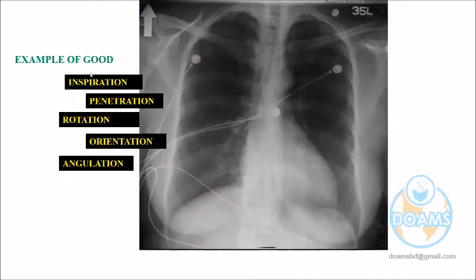Now, an example of a good X-ray. Dr. Heen, please read out the points, one by one. Technical qualities: one is inspiratory film, then technical quality good.